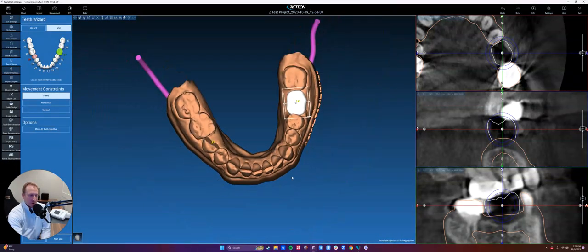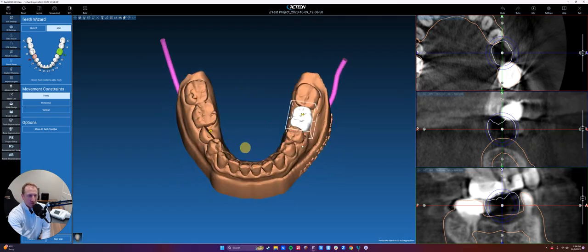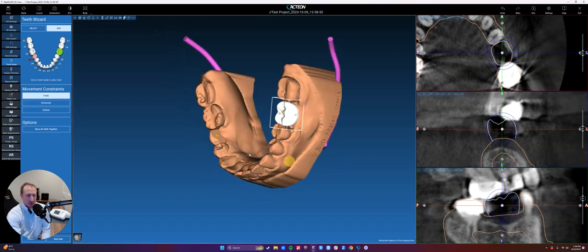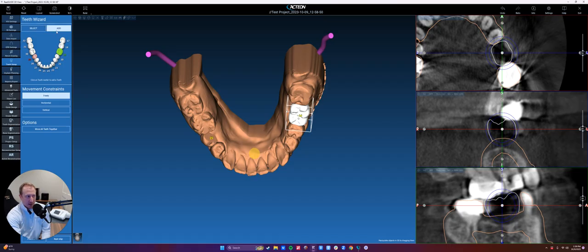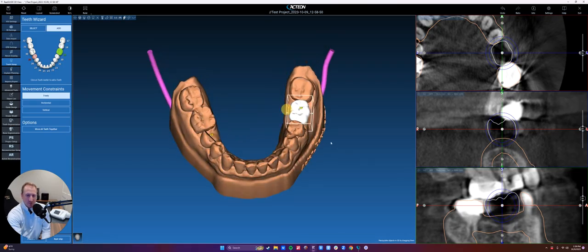Now you can use this for all the teeth. You could do a wax up bridge from 6 to 11. It's really useful for these edentulous single sites, or if we're trying to plan aesthetic cases and make sure we have our implant positioning where the teeth will be best supported. But that is to show you kind of the ideal is how to just drop a tooth in. Make sure you select the add button instead of select, and you can then do a little digital wax up.